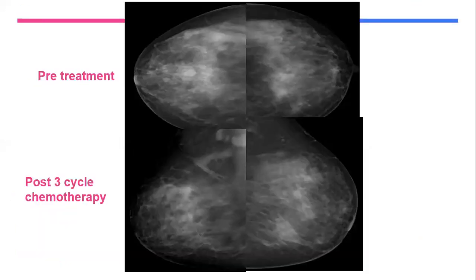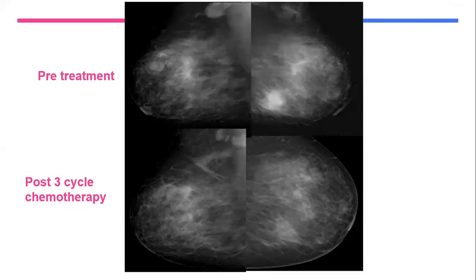And this is the same patient. Look here, this is the early case, and this is post-neoadjuvant chemotherapy. The cyst, you see, is significantly regressing, as well as the left breast cancer. I appreciated the left one and characterized it correctly, but I missed the right one. And look at the lymph node, how it regressed post chemotherapy treatment. Yes, this is here.